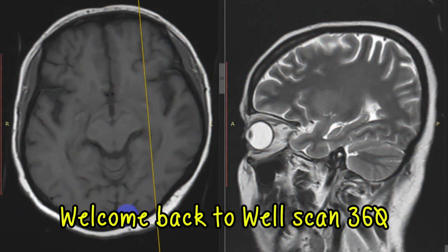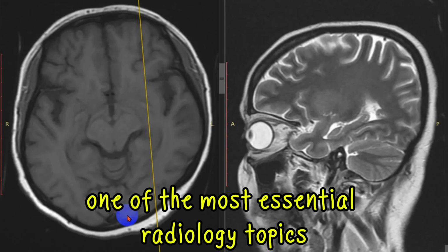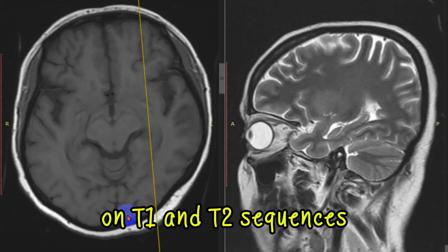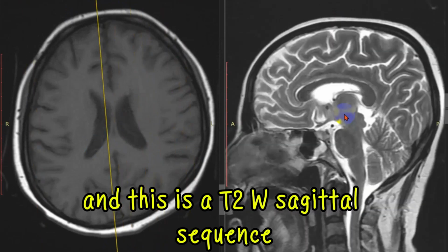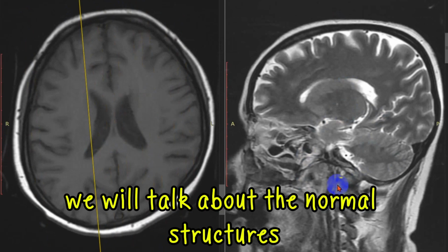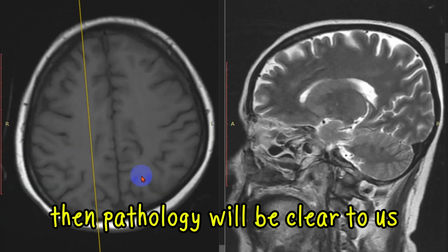Welcome back to Scan360. Today we are diving into one of the most essential radiology topics, understanding the normal MRI anatomy of the brain on T1 and T2 sequences. Here we can see this is the T1 weighted axial sequence and this is a T2 weighted sagittal sequence. In this sequence we will talk about the normal structures, because if we understand the normal structures, then pathology will be clear to us.